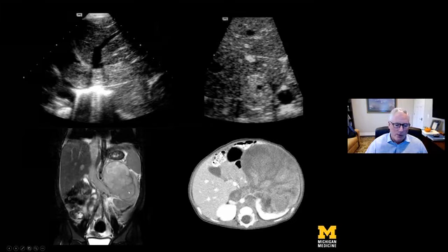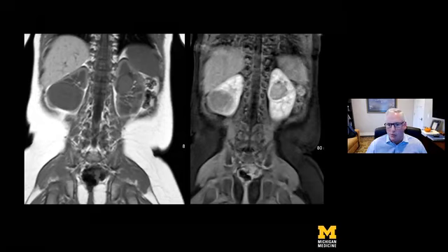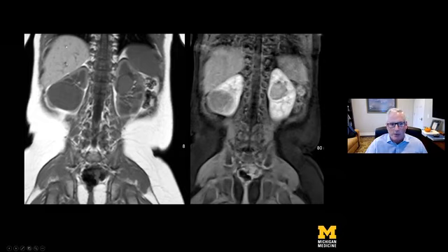On this MRI, a Wilms tumor on the left renal vein extending up the IVC. As I mentioned, stage 5 Wilms tumor will show you bilateral renal masses. And so we have that in this particular patient. You do have to wonder about underlying nephrogenic rests, precursors to Wilms tumor, and also certain genetic predispositions that might lead to bilateral Wilms. Again, you can look at the liver, but liver metastases are not that common in classic Wilms tumor as compared to lung metastases, which you can pick up larger lesions on MRI within the lung bases.